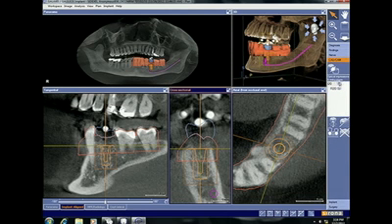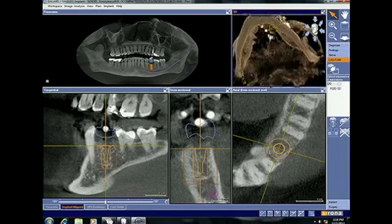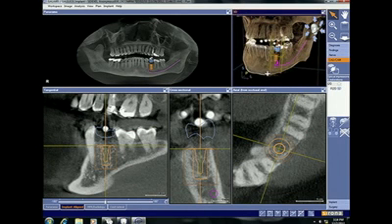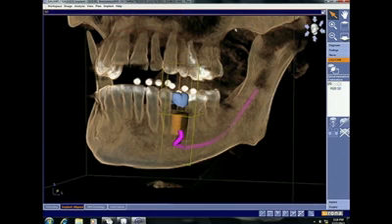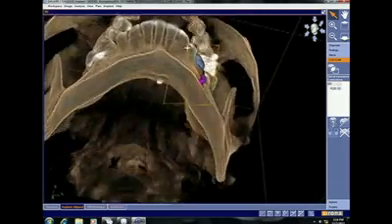What I'll do at this stage is make mention of what the purpose of making that scanning appliance was. When you look closely in the 3D environment, you see the fiducial markers that were embedded inside of that reference body.